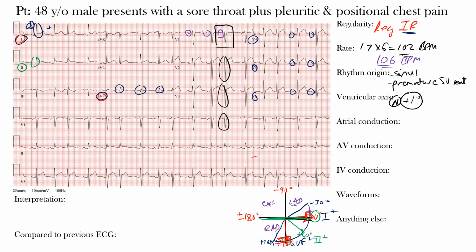So let's look at what we were saying by that possible left atrial enlargement. Here's V1, and you can see this terminal portion of these P waves. What we're seeing is a biphasic P wave, so that's all of atrial depolarization. And why does the terminal portion represent the left atrial depolarization?